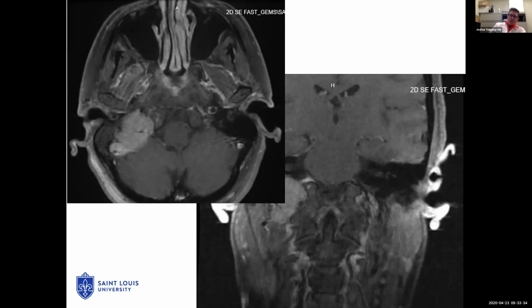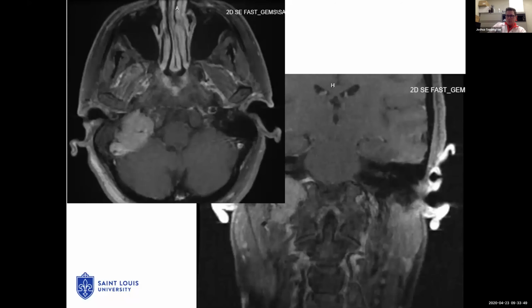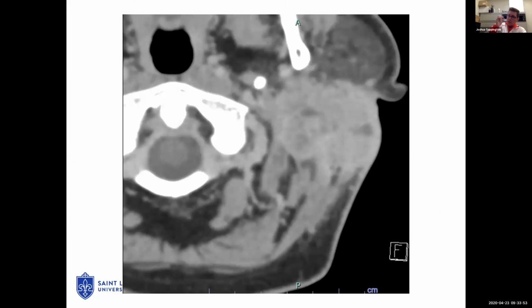She also had a mixed hearing loss with a large conductive component and pulsatile tinnitus. Interestingly, all of her cranial nerves were absolutely positively intact with everything. We'll get to talking about managing those, but that's just a classic imaging finding for people.